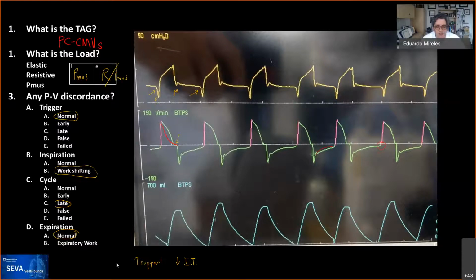And so I think that these are the two items that I would change. And I think that this is very similar to what people are putting as options for the ventilator, including liberation from the ventilator. But this time, pressure support is another alternative, so that you don't have to deal with the I time. So using pressure support, PC-CSV, would deal at least with the I time, and then you can increase your support as needed. Aman, any other? Let's see what the audience read and go from there.